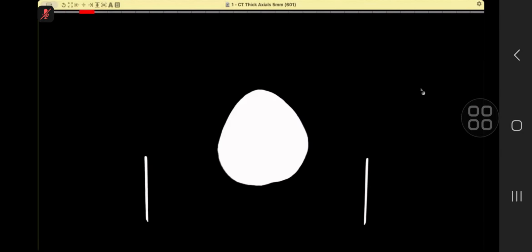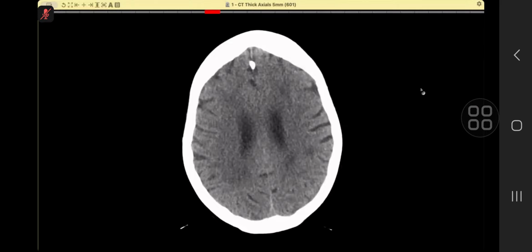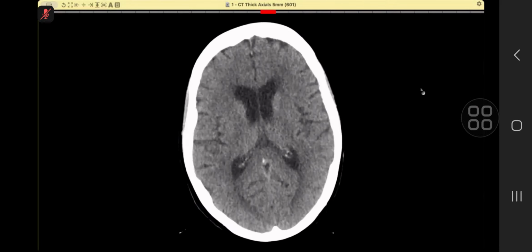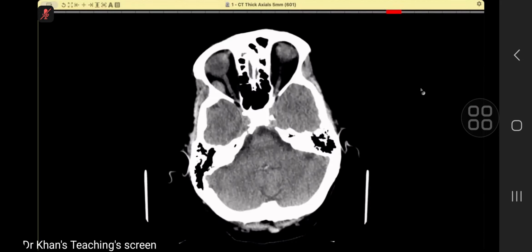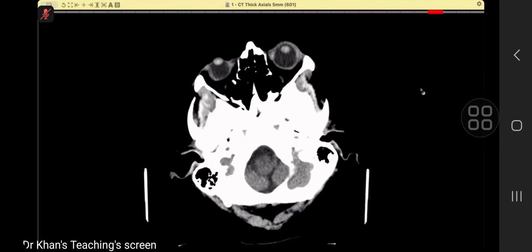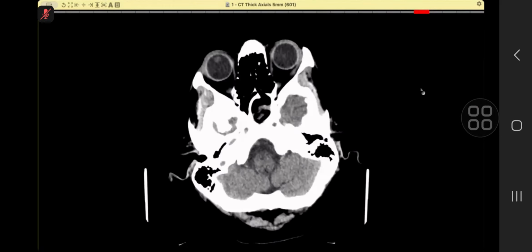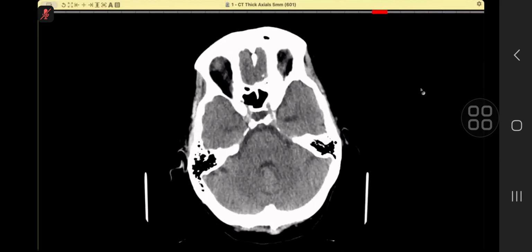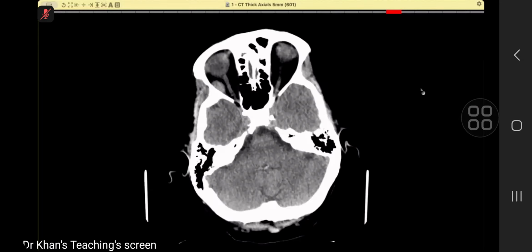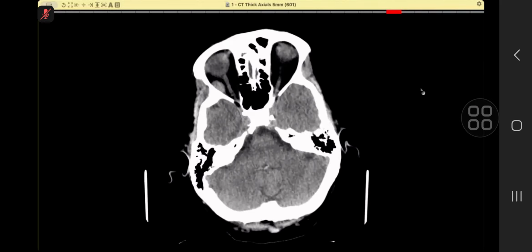These are plain CT head and neck images of a patient who is a known case of breast malignancy. I will try to give it a scroll and we'll start commenting then. So in these sections, I have observed that there are bilateral intraorbital extraconal soft tissue density masses seen in the region of the lateral rectus muscles.